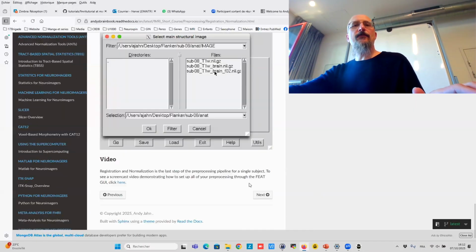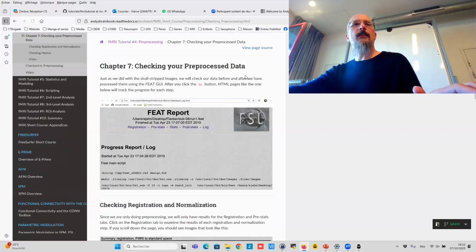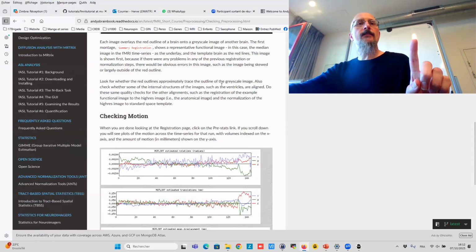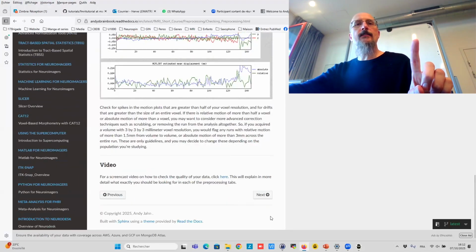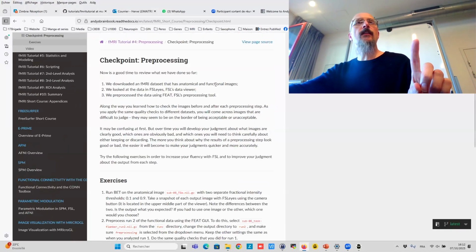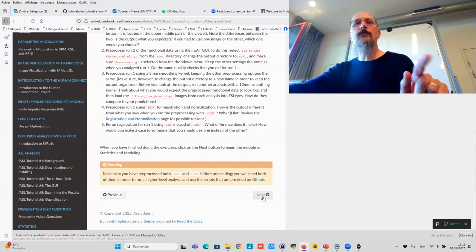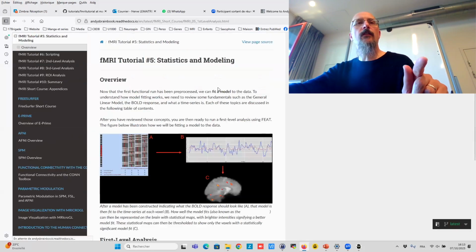Okay, so that is the feed. So what else? Let's see, checking motion. Yes, we did. Again, you can go back to it. There is a lot of exercise if you want to practice, changing all the options.